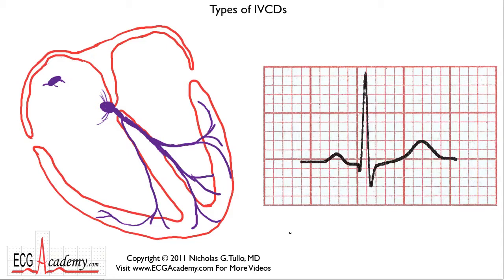Hi, this is Dr. Nick with the ECG Academy, and we're going to continue our discussion of interventricular conduction disturbances. In this chapter, I'll cover the types of IVCDs we can diagnose on a rhythm strip. First, a quick review of what we covered in the first chapter.